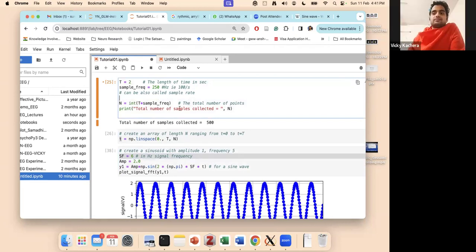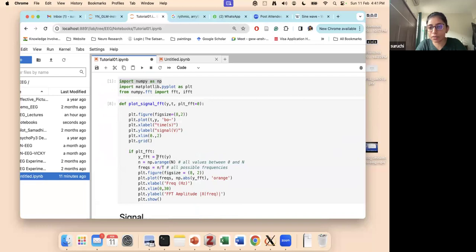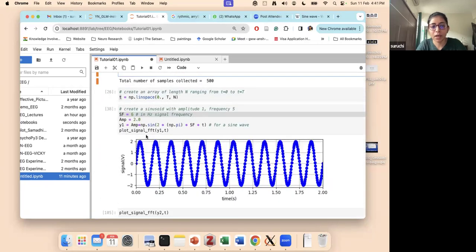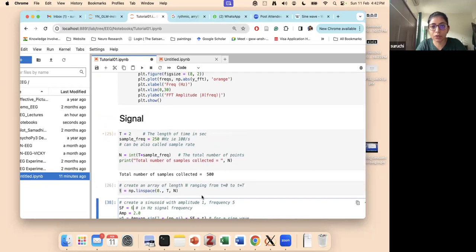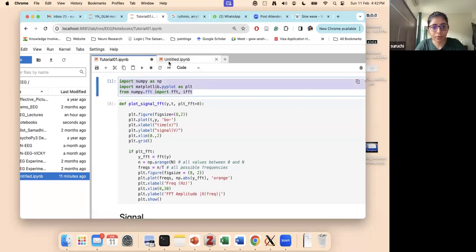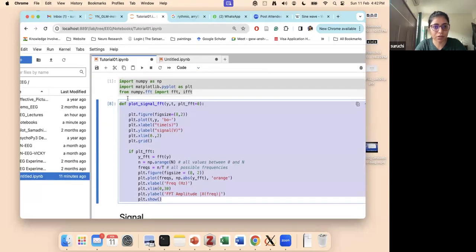So I'm going to stop here. I'll share this notebook up until this part. I've created a function that does the plotting for you. So you don't have to, but you can check what I'm doing here so that you understand. Later on, you can play around with those parameters also. But here, as you keep changing these things, see how your plot changes and try and understand it. Okay, so this is a demonstration thing. So you can just play around in your Anaconda. And if you get stuck, you can let me know. Just give me 1 second. I'll copy these things and ensure that it's still working because there's more stuff in this notebook.